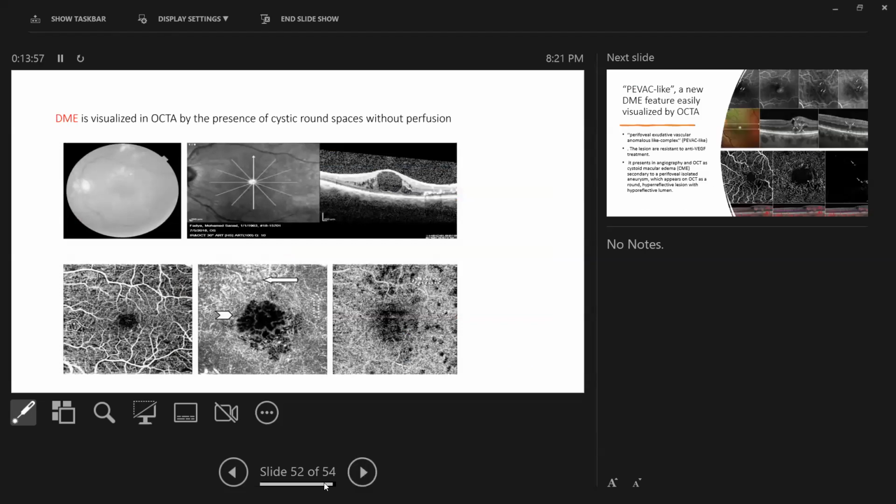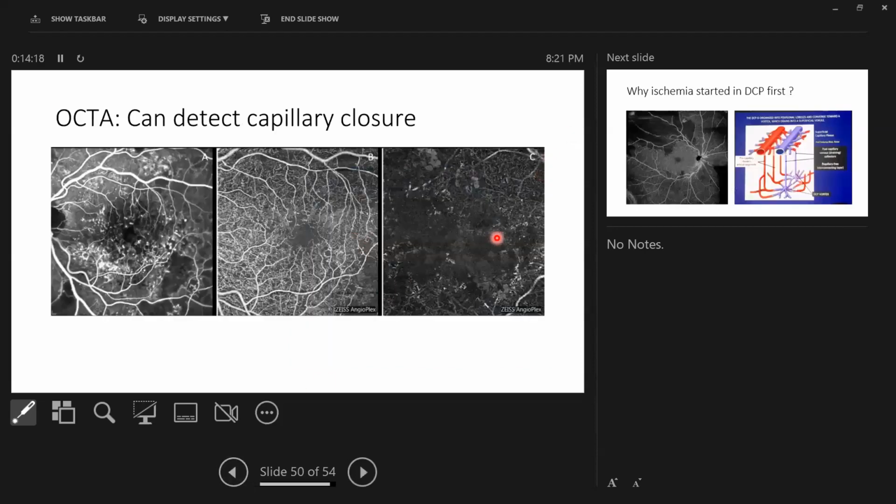Can I have a question? Yes, please. On the previous two slides, we've seen with the OCT angio superficial angio, yeah. The fluorescein angiography, there is a capillary dropout. Perfusion. It's reflected in the deep OCTA cuts, not in the superficial. You mean this? Explanation, yeah. If we go to this slide, this one, not the other side. Sorry, you mean this? No. This one? Yeah. Down. Yeah, there is ischemia. Yeah, I totally agree with you.